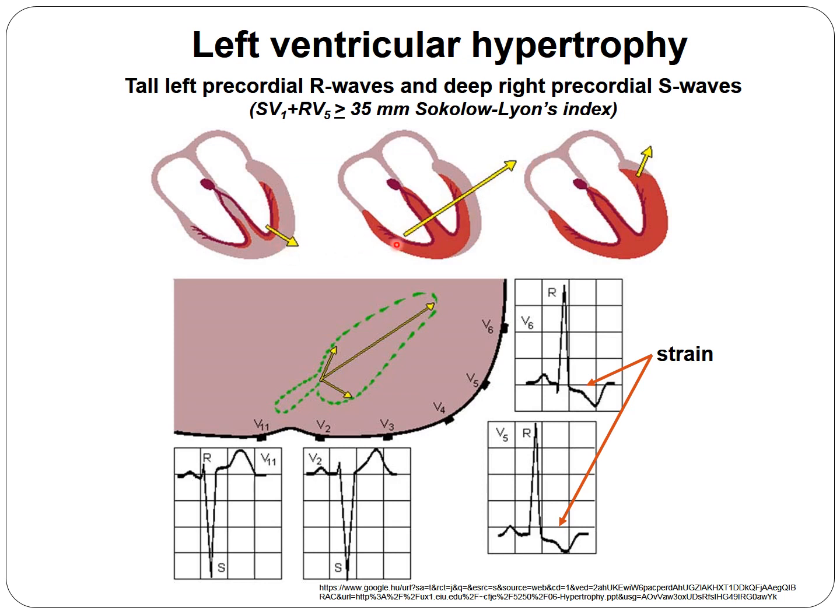After that we have a very large one for the left ventricle activation, and the terminal one points toward the left. This is why everything goes away from the right side. The initial R is a septal one, and after that everything goes to the left side, so RS, and the QR wave in V5, V6, usually associated with repolarization abnormalities presenting as a strain phenomenon.